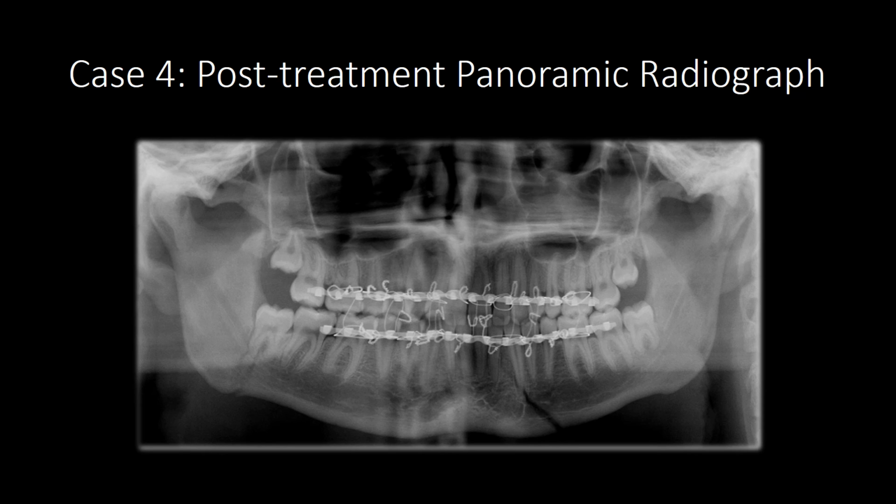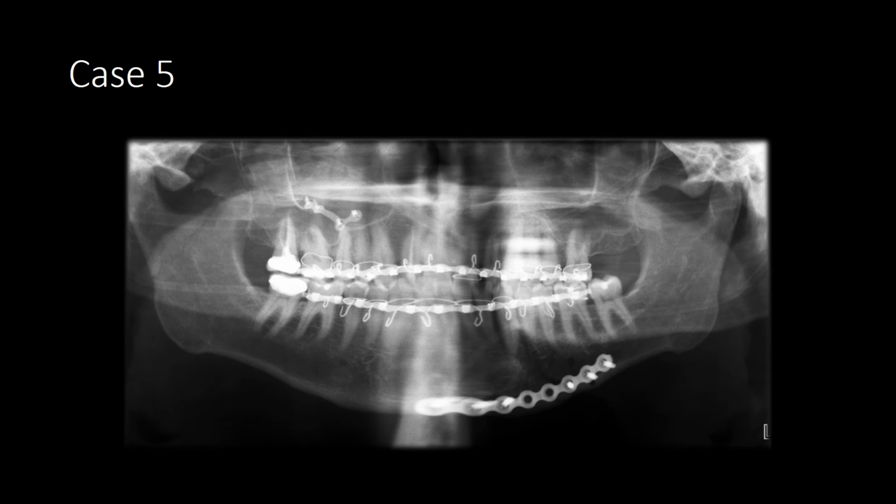It's also really important to look for any loose wires. A loose wire may be on the lingual side, which would require actually release of the fixation in order to retrieve. In certain cases, the fixation may be achieved with heavy elastics instead of metal wires, and those will not be visible on radiographs. So this is a new patient.